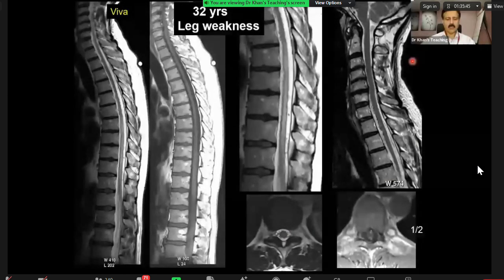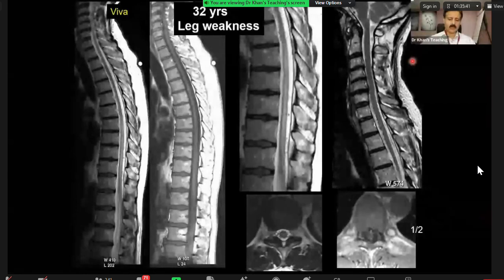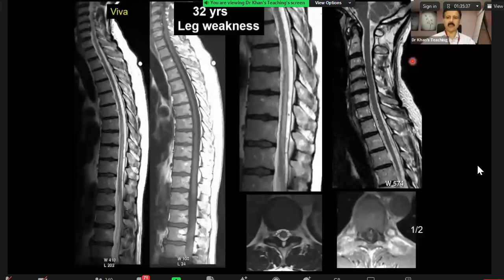Excellent, well done. Now, dural arteriovenous fistula, I used to think that it is slightly beyond 2B, but it started coming, and that is why I say the bar is going up and up in the exam. There are many types of vascular malformations in the cord, and this one is the most important, which has come in the exam quite a few times.